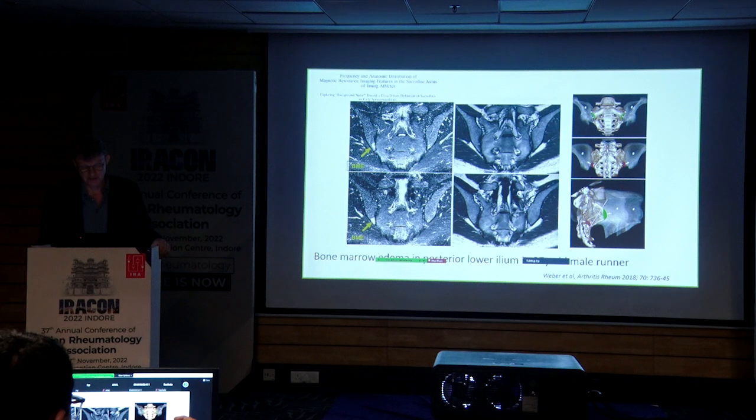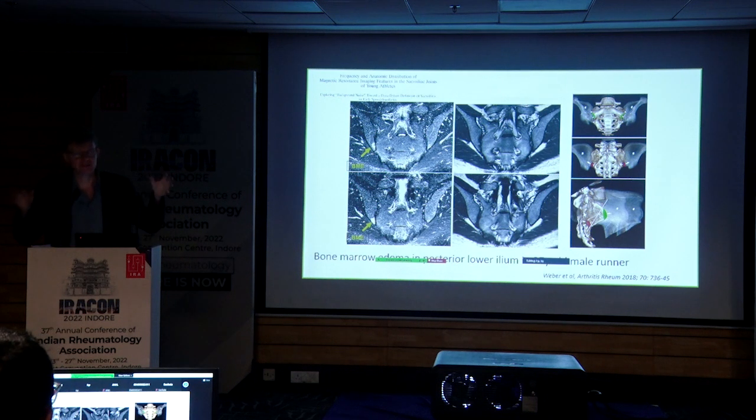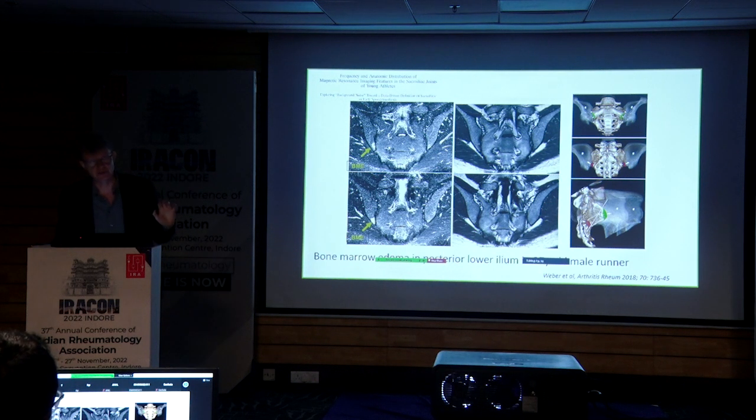These two areas. You can also have axial SPA changes there, but if you only have changes in one of these regions, then you should be very suspicious and say, okay, that's probably so unspecific, it can very well be due to a lot of other things than axial SPA. While changes in the middle of the joint, the mid portion here, that's much more pointing towards a diagnosis. So you can have the changes, but they're not specific.